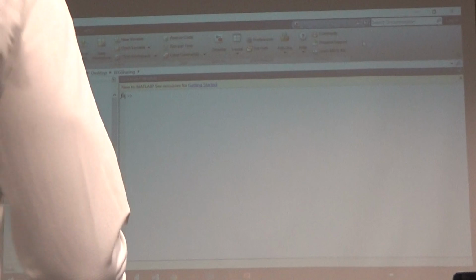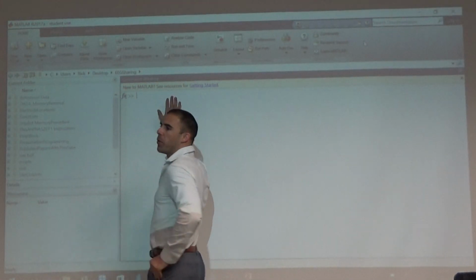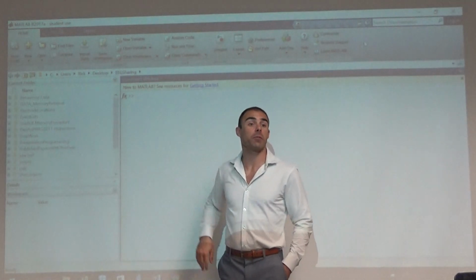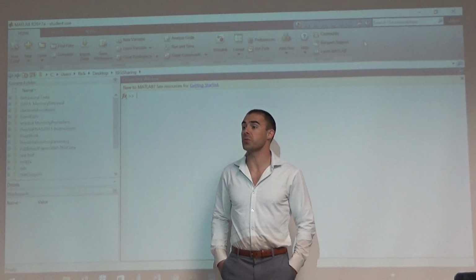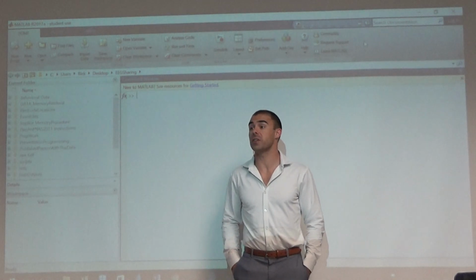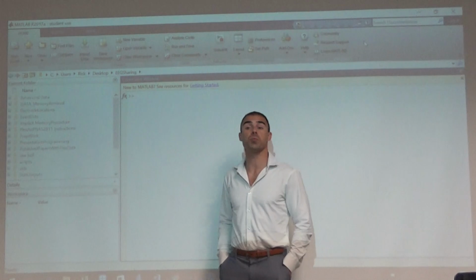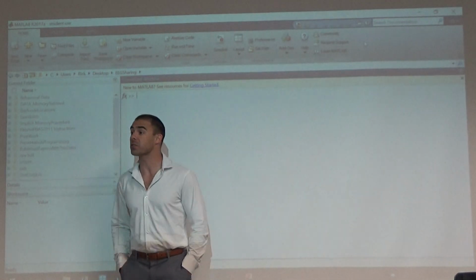Okay, you guys ready for this next part? We're going to be working in the MATLAB environment, so make sure you open up the MATLAB software that we've installed, and we're going to start cruising through some EEG stuff. Okay, start learning how to process data, because later on we are going to be processing a lot of data for your studies, and it takes a long time to learn how to do it.